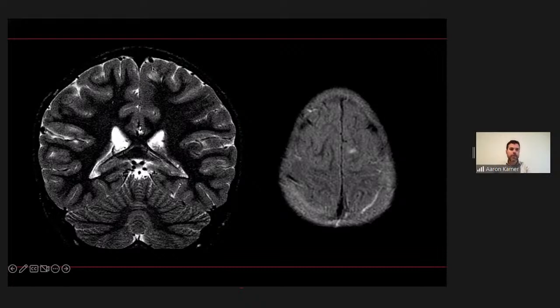13, 14 years ago, I was reading this case with one of our senior pediatric neuroradiologists who thought that there was a little cortical thickening here and then a little bit of FLAIR hyperintensity immediately adjacent to the cortex that showed up here, not just on the T2 images where it could easily be mistaken for dilated perivascular spaces, but did also show up on our FLAIR images as an abnormality that could indicate some of that Taylor type, starting to get into the white matter looking like a transmantle sign, although not all the way across the white matter.